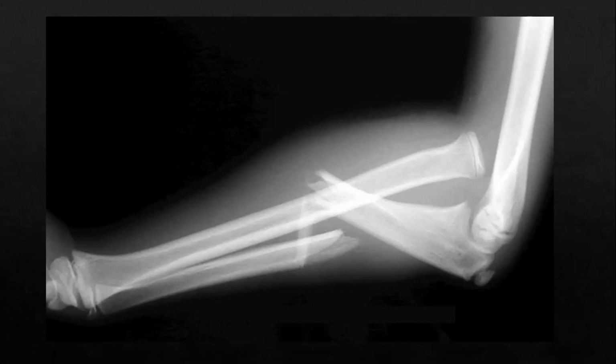The most prominent thing I can see is a fracture of the proximal, just trying to work out which is which. Don't worry, it's tricky. The proximal ulna. Yeah, that's right. It seems to be completely displaced with dorsal angulation of the proximal half, and the distal half doesn't seem to be angulated as much in either direction.